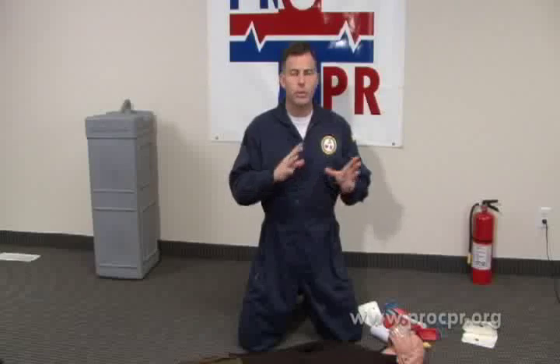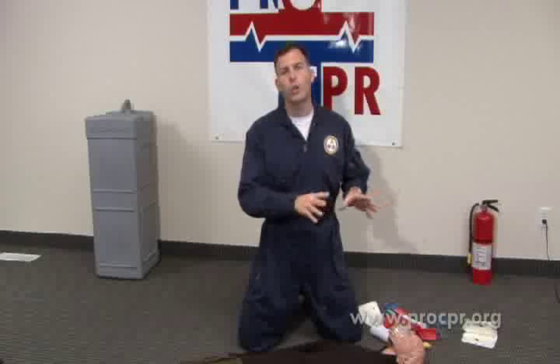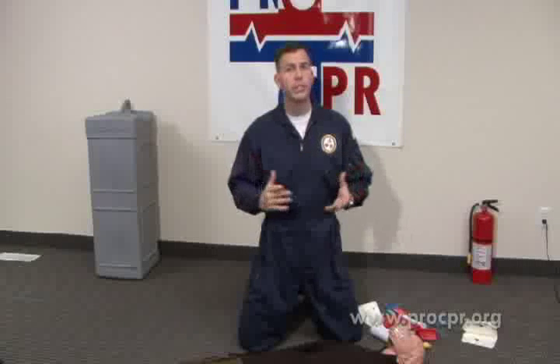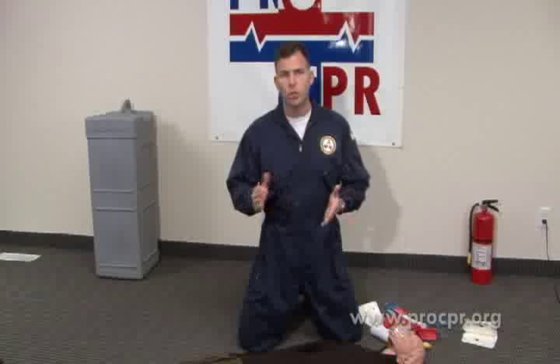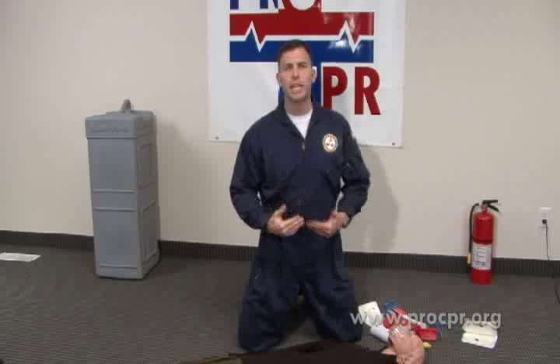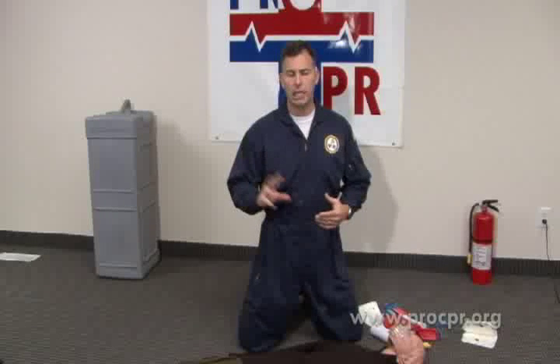Now, a couple differentiating facts here in regards to AEDs. You're going to be seeing some of them still out in the community and on floors potentially that have been actually programmed to still follow the 2002 guidelines. The 2005 guideline AEDs are those that are going to be released ever since January of 2005 or a little bit later. Both will do the same job in the end, but for all practical purposes, we're going to be using the 2005 guidelines with an AED trainer that's been programmed at those guidelines.